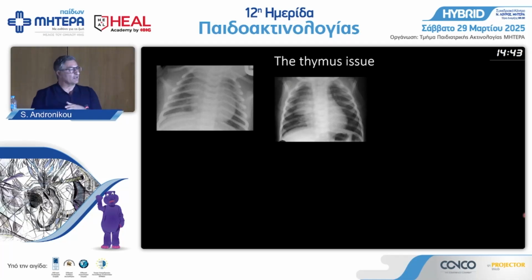And this one too, this is a typical sign. It's got a wavy margin of the thymus. Why is it wavy? Because it's anterior, it's pushing up against the ribs, and the thymus is supposed to be soft. So the thymus is the child in the playground that's getting bullied. He never bullies anybody, right? Everybody pushes on the thymus. The thymus cannot push on anybody. But when you have disease, the disease is pushing on everybody. The disease is the bully, okay?